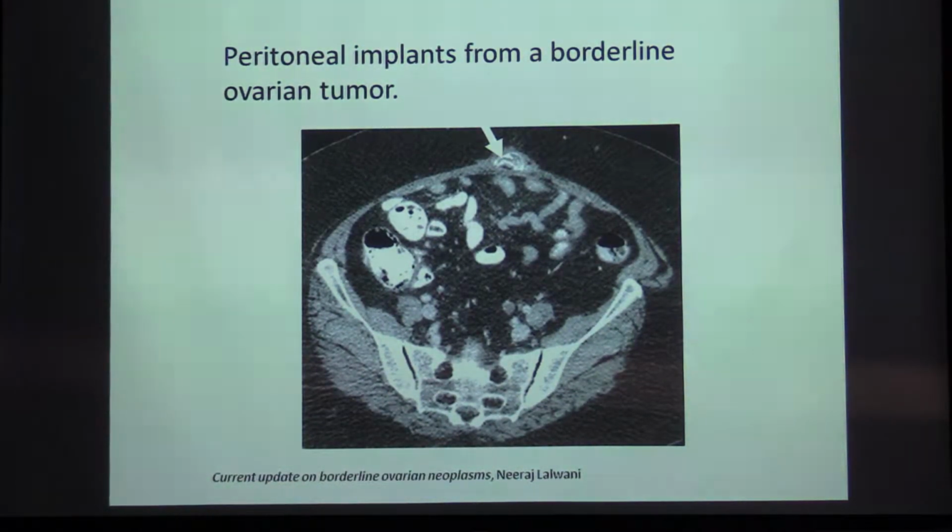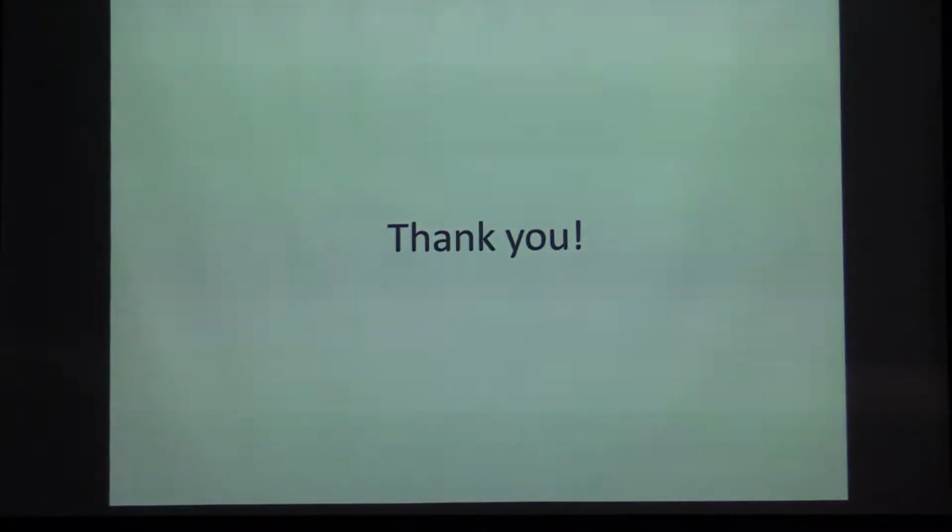Actually, it was peritoneal implants from a borderline ovarian tumor. Indeed, one of the distinctive features of the borderline tumor is that peritoneal implants don't mean it's invasive cancer. Okay, thank you.